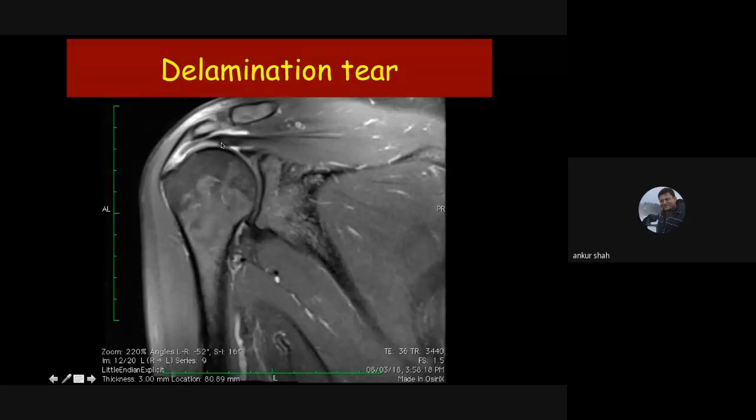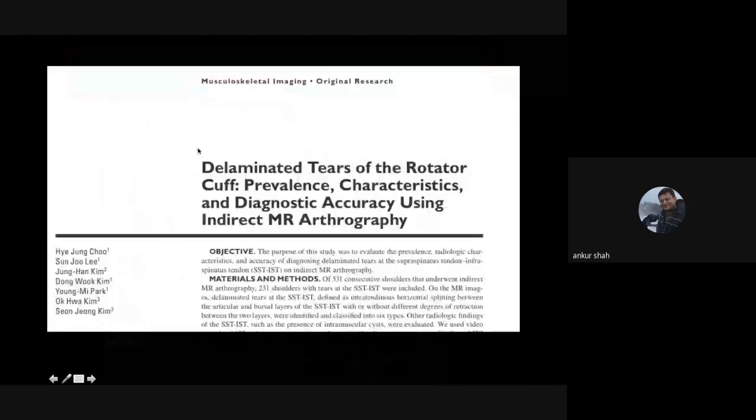So if the surgeon has to do any surgery, they have to pull the fibers from here because these are very few fibers to give stability. If we give a measurement of only this much retraction, which might be around 1 centimeter, and tell the surgeon that the retraction is just 1 centimeter, then he might be tempted to go for surgery, thinking he can easily pull the tendon and do the fixation here, but that is not the case. When they do the surgery, they have to actually pull the tendon from here because the bulk of the tendon is here. So this retraction is almost 3 centimeter. To give them an exact idea, we have to tell them that the bursal sided fibers are 1 centimeter retracted, but the articular sided fibers are much more retracted, that is 3 centimeter.